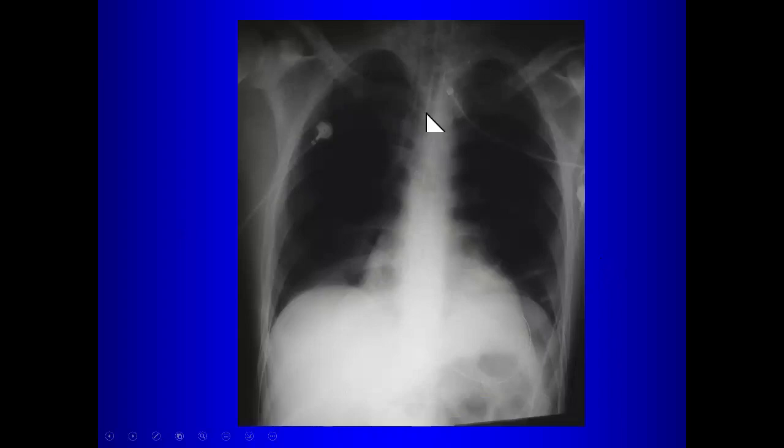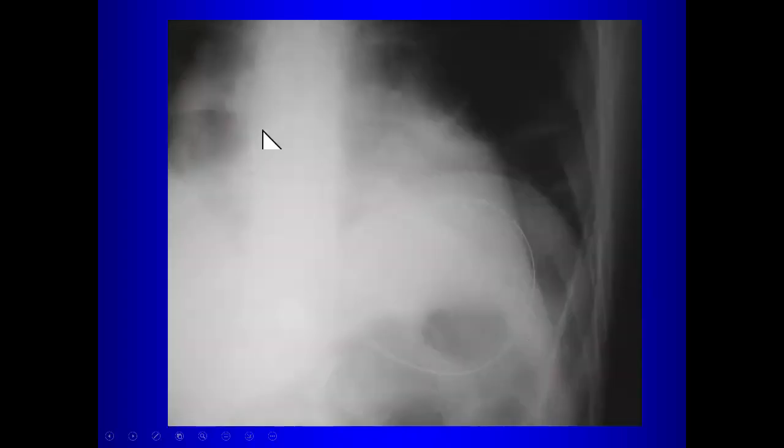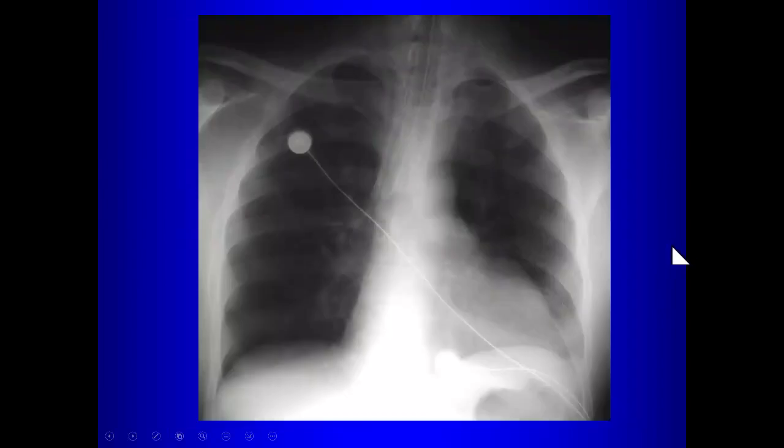So this guy here is an endotracheal tube, and then this guy here, what is this? NG tube, nasogastric tube, right? So again, we have a break in the line, that's the hole closest to the outside. You want this below the gastroesophageal junction, because if that is above the gastroesophageal junction, and you should happen to put fluids or anything through this tube, what's going to happen? Fluid. They go back up. It's going to go back up the esophagus, and then what? Aspiration, right? So you don't want that. So you want to make sure that the nasogastric tube side hole here is below the gastroesophageal junction.